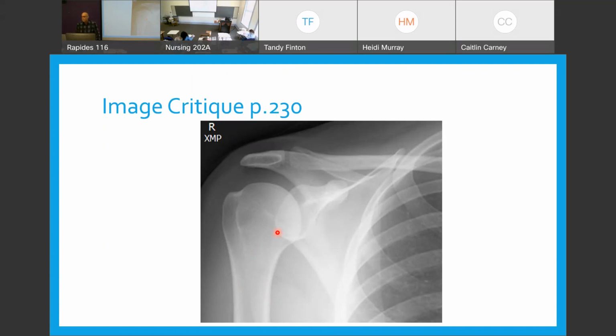The difference between this picture and the one in our book is that this one is over the glenoid cavity more than the one in our book. That's why I'm confused. That's why I thought it was internal. Always go with your tubercles. The one that has the greater overlap is your neutral. Is it what? Internal. Because this definitely shows a lot of humeral overlap. So just keep this in mind. Every x-ray is not going to look identical to your book, so go with everything that you know. I would have gone with these two over here. That definitely is pushed out and rounded off. I always think the greater is the one with that great big hump over here on this side.